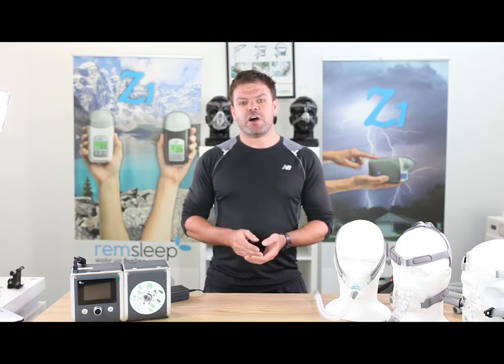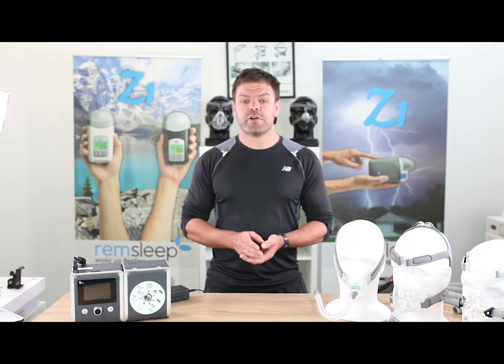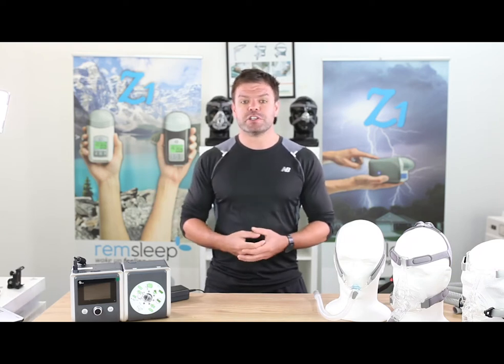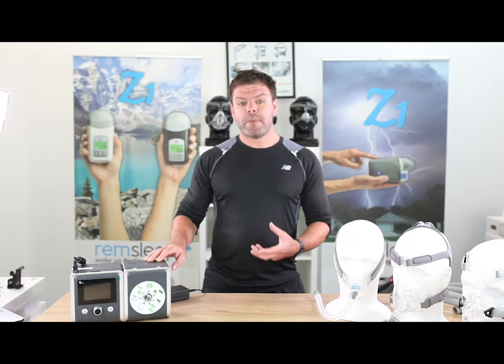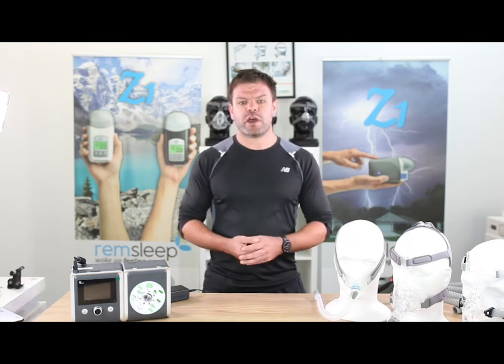If your AHI is between 5 and 15, it means you're in a mild category, 15 to 30 in a moderate category, and if you're above 30, you're in a severe category. If your apnea-hypopnea index is over 10 whilst using your machine, we may need to look at changing some of the clinical settings or consulting with your healthcare professional.